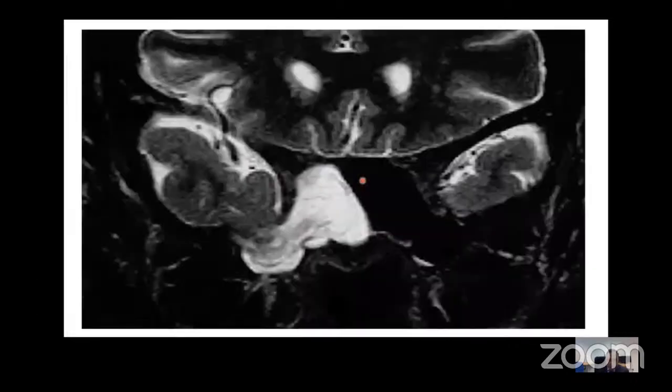And when we do an MRI scan of the sinuses, we can see the right sphenoid is opacified, and it has a high signal intensity. Also there seems to be herniation of the temporal lobe of the brain into the sphenoid sinus. So this can occur in benign intracranial hypertension. When you see a patient with BIH with sphenoid opacification and it is more fluid, please make sure that you get an MRI scan as well, because the entire temporal lobe can significantly herniate through these lateral defects into the sphenoid sinus.